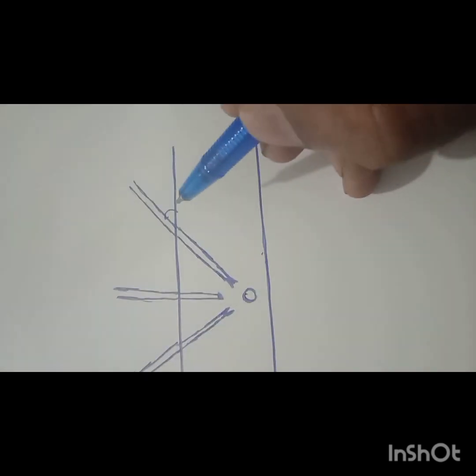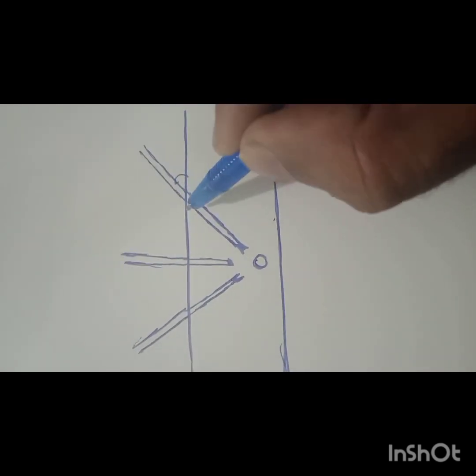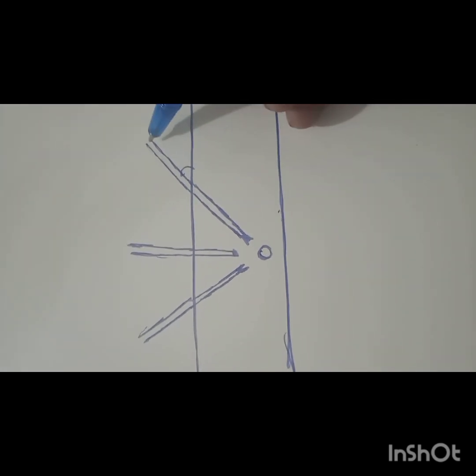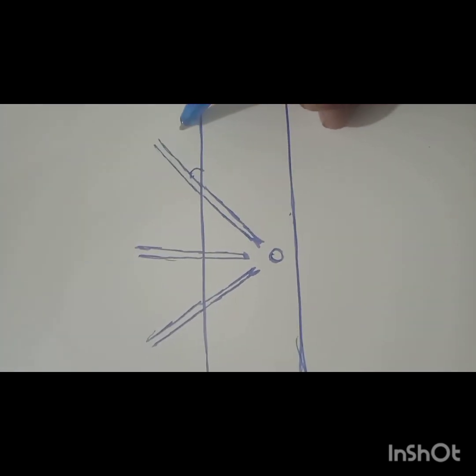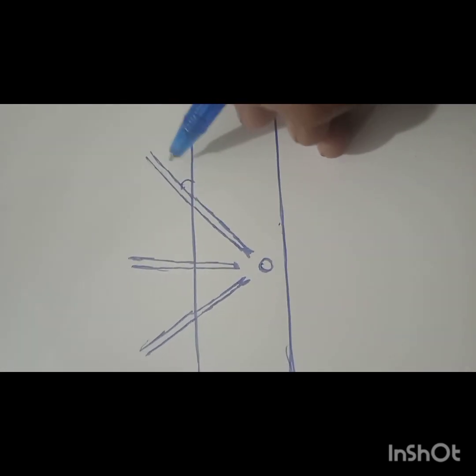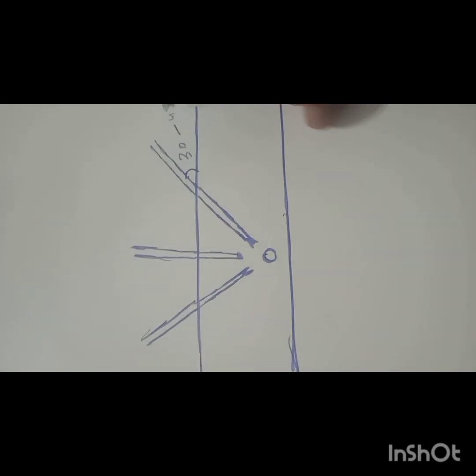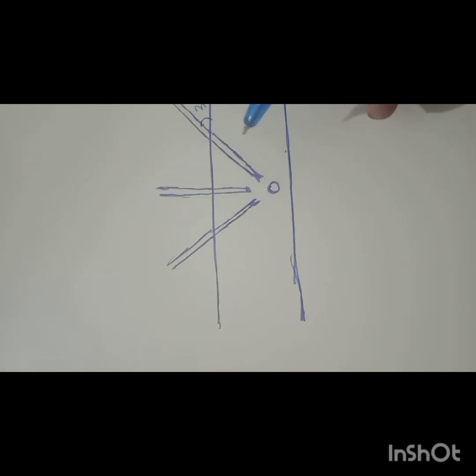The angle of elevation is defined as the angle between the horizontal plane or abdominal wall and the instrument. This must be 30 to 45 degrees, ideally 30 degrees.